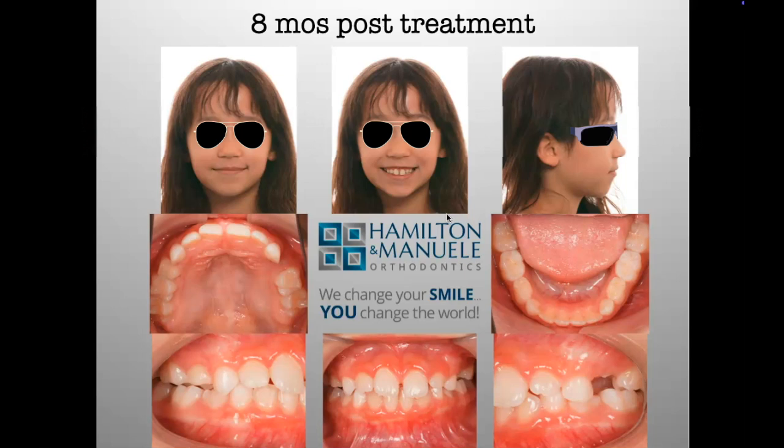You can see the midline. Did it do pretty much what we thought it would do? Right, yeah. We didn't think it was going to shift all the way back based on what we saw in the condyles, but overall I feel like it did a pretty good job. It at least shifted halfway back, right? So that's good. And when you look at the facial photos, the asymmetry of the chin to the right is not nearly as noticeable as it was, although if you look closely, it still is there, right? And again, that's because that lower jaw has grown slightly to that side.